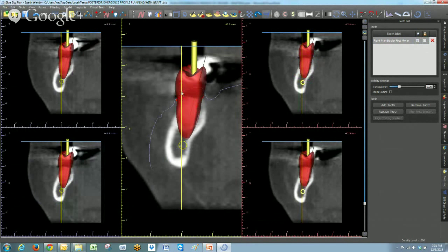And we put the tooth back in place, and you can see how much of this part of the tooth won't be there after the molar's carved, and you'll have a concavity on the facial of the tooth. I hope everybody can see that pretty clearly. This is the part of the tooth that we would not include on the carving of the tooth itself, so that the implant crown would emerge out of the gums.